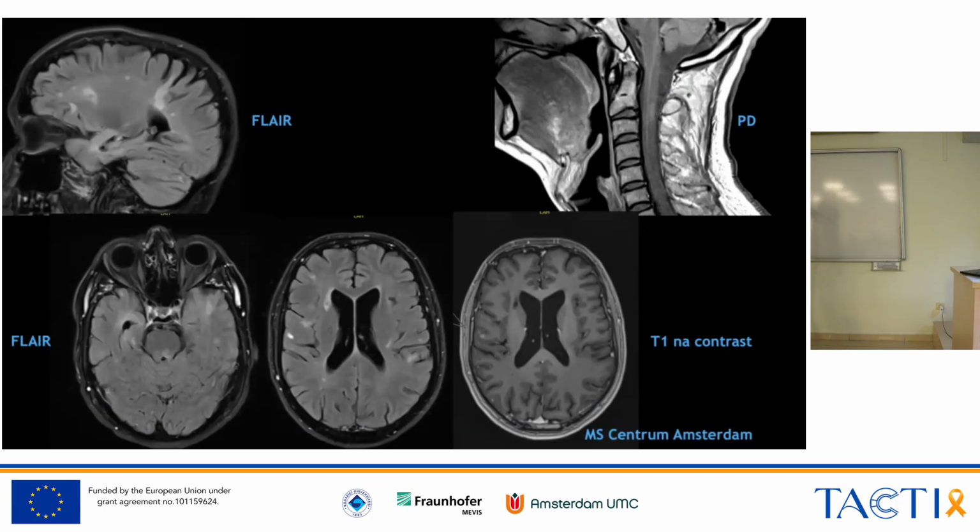And then if you look at the location in the spinal cord, you can have it in the center or in the front or in the back. I forgot. So it's the back. What do you think, Vera? Yeah, I see the tongue there, so assuming that this is the front. So this is the tongue here. And then you have the back of the head here. So you've got your vocal cords, where you speak with, your epiglottis, your tongue, your chin. And so this must be the neck where you can grab it.